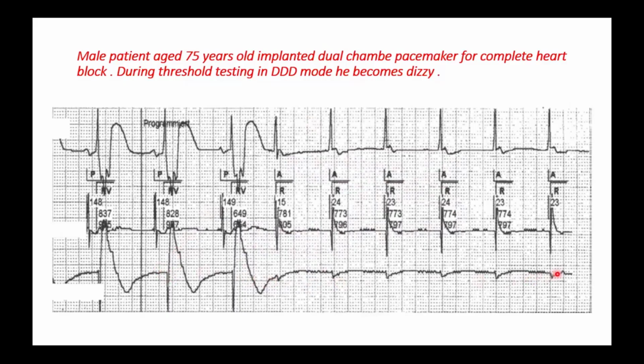In the ventricular EGM, you can see the spike, appreciate the first three beats: spike and QRS complex, spike, QRS complex, spike, QRS complex, and then nothing. What is this nothing? There is a far-field atrial spike, the small one in the ventricular chamber, which gives a wrong value, as if this is ventricular activity. This is why crosstalk is dangerous, because one chamber can give false orders to the other chamber that there is activity, and this makes the patient go into syncope, maybe arrest.